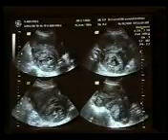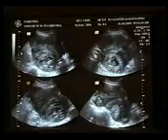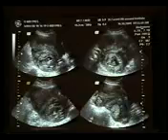Yolk sac is here. An abdominal pregnancy, an empty uterus you can see, and you can see a sac, a mass containing a fetus. It was an extrauterine abdominal pregnancy. Normally the ectopic pregnancy, the tubal one, does not go up to this size. This is a larger one. It was abdominal pregnancy. It was not in the tube. It was outside the tube and outside the uterus.